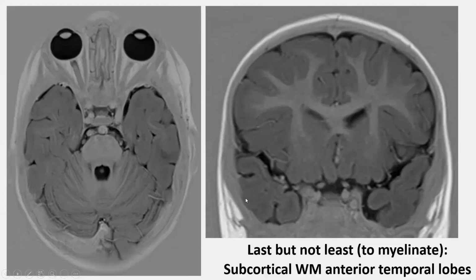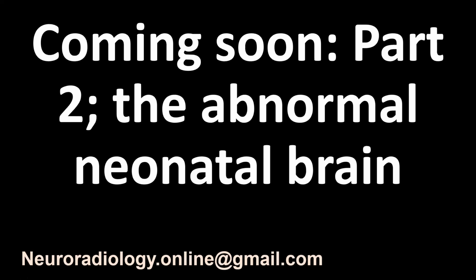We see that here very clearly on a T1 weighted inversion recovery image. There is no myelination yet of the subcortical white matter in the temporal poles compared to the subcortical white matter here of the frontal lobes. And this concludes my overview of normal myelination in the neonatal brain.